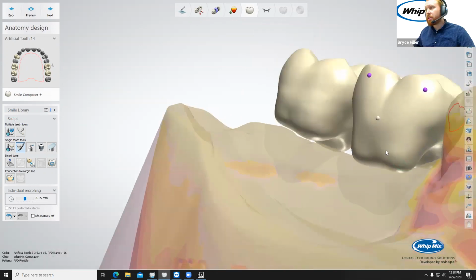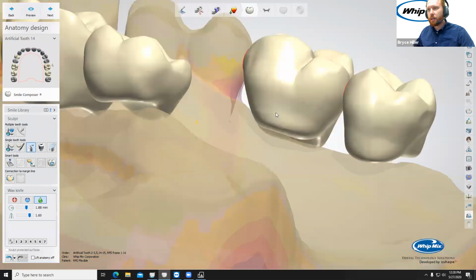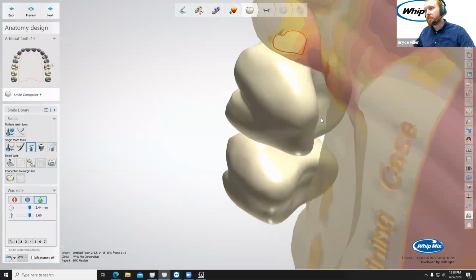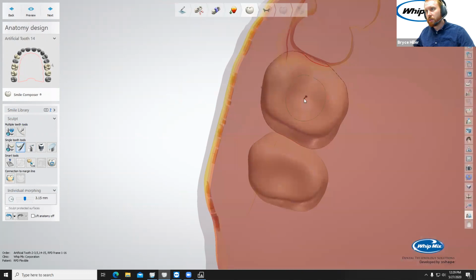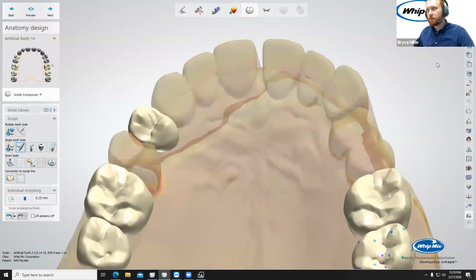In 3Shape, maybe like 5 years, I'm not sure. But before that, I have prior CAD experience as well, so fortunately a lot of that translated over to 3Shape, some of the basic principles of CAD design. All right, I'm going to stop fooling with this, or else we're going to sit here all day. Hang on, one more thing. Okay, that's fine. I know it's ugly and terrible, but I'm not going to spend all day on it.